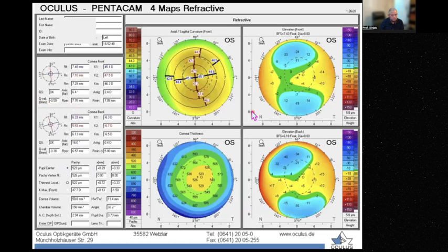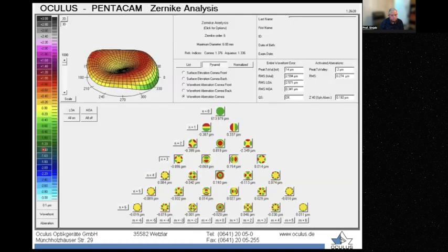And the next question is, there's the RMS value. Can you repeat the relation between it and the trifocal? Yeah. Now, if you have less than 0.35, you can implant trifocal because you are happy that the patient most probably will not develop dysphotopsia after the operation.